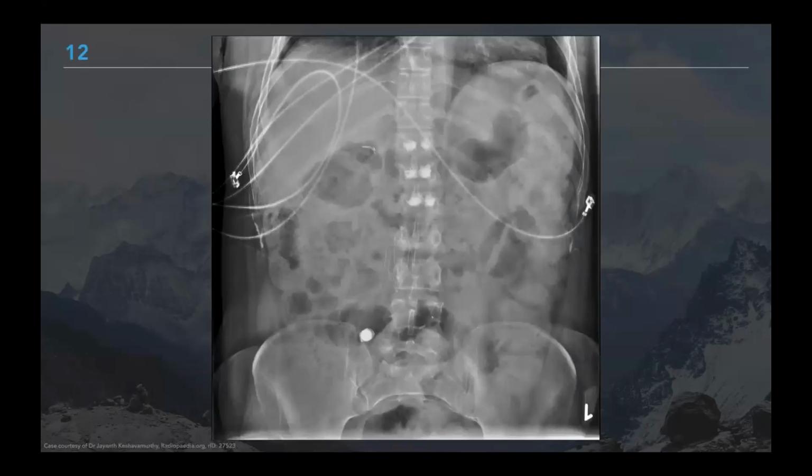Okay, cool. So number 12, this is getting on to the last one now. In fact, I think this is essentially the last section. So again, what would I say if I was in an exam? The theme here is densities, calcified things, external devices. Again, much of this talk is just make sure you've seen it before so that if you see it again, you'll know it. Okay. So there's a lot of bang for your buck in this one.